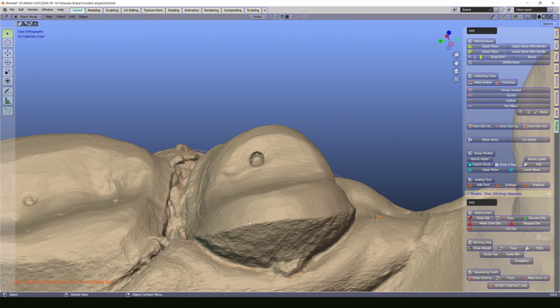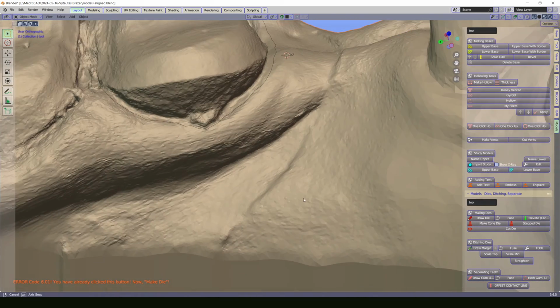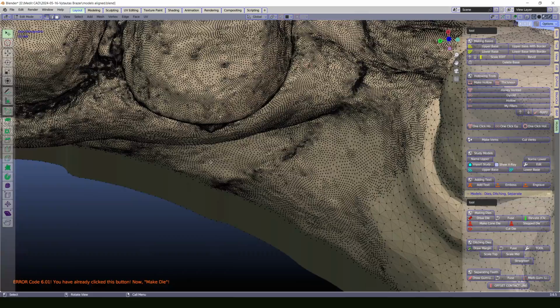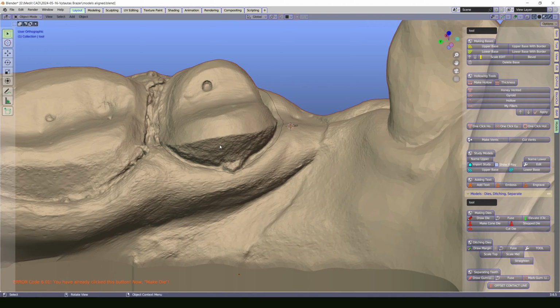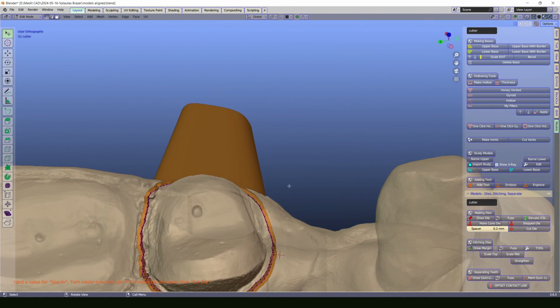Click a few times. I think it's all right. So I repeat it one more time. Make a cone die. Yes, it's working.